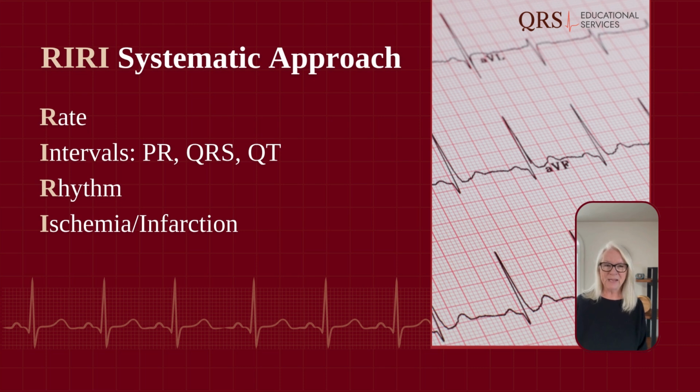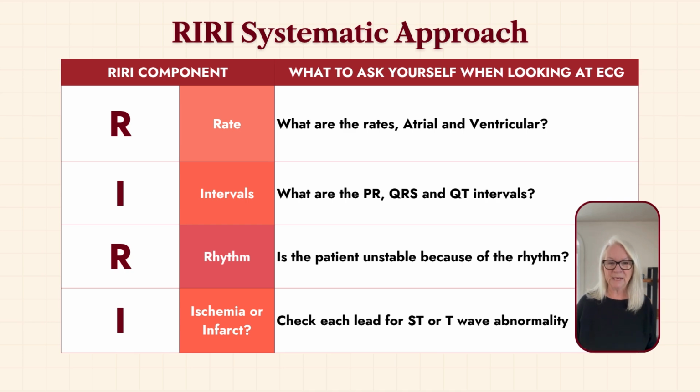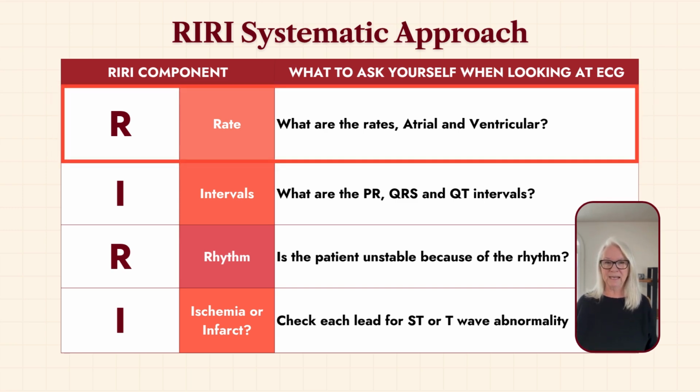I developed the RIRI systematic approach decades ago to help me when I was first working in CCU so I didn't omit anything important. The first R is to calculate the heart rate.